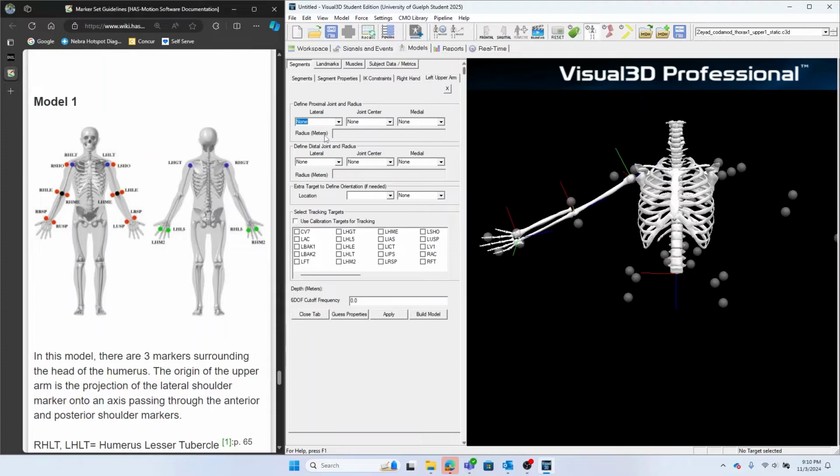But if you need to pause, feel free to do that whenever you'd like. So yes, let's, again, feel free to have this nearby so that you can relate and know what each marker stands for. But I'll go ahead right now, and then I'll input the markers.